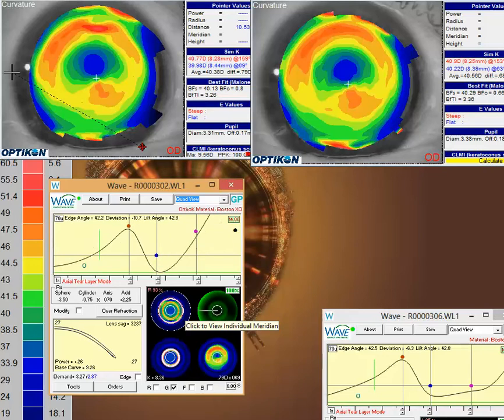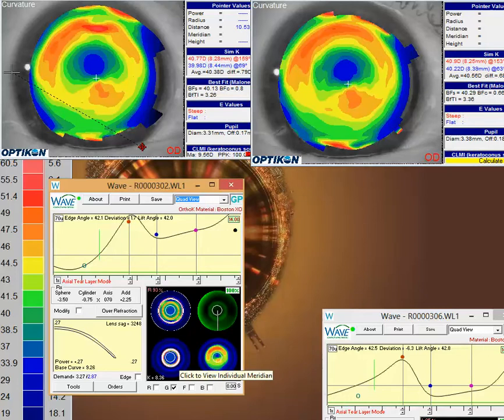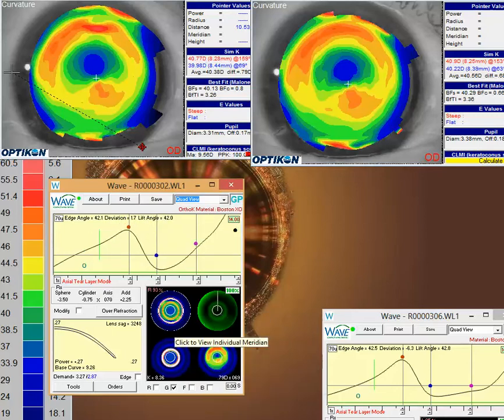You're going to notice some areas that aren't quite perfect in here, and that's more of a function of this rather displaced ridge here in the cornea. But I wasn't quite able to tell from your clinical request if the right lens was fitting well enough. It sounds like the left eye was doing well, but if the right lens is fitting well enough, then I might be inclined to just make the adjustments for the powers and go from there.